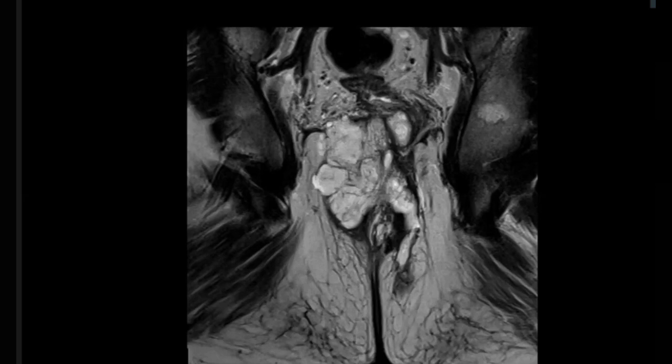These are the axial images, which are confirming my finding, and it is likely a perirectal collection with a fistulous communication reaching up to the skin. The underlying systemic illnesses need to be ruled out in these patients, because usually these fistulas and such collections can be seen in patients with chronic inflammatory bowel disease.